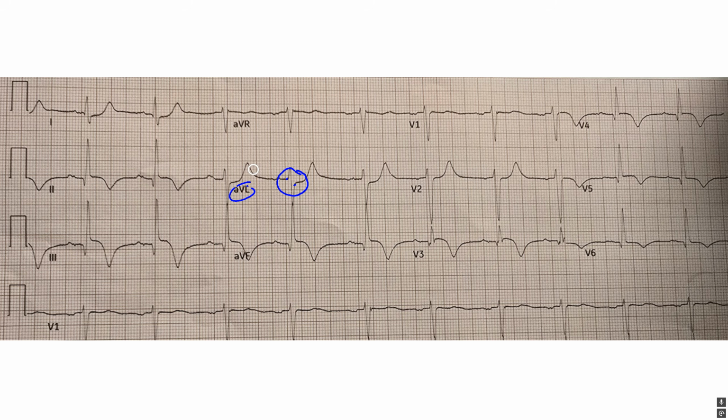If you note, we also have this hyperacute T wave, as you can fit almost a tiny QRS underneath there. Similar appearance in lead 1. We have 1 millimeter of J point deviation and this hyperacute T wave. Up here in lead 3, a little bit of J point deviation. No, I'm going to say that J point's on the line. And we have T wave inversions, which is abnormal. Here we have J point deviation of 1 millimeter and T wave inversions, which is abnormal. AVF, 1 millimeter of J point deviation and T wave inversions.